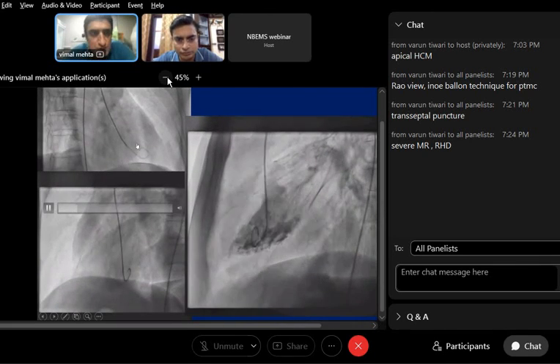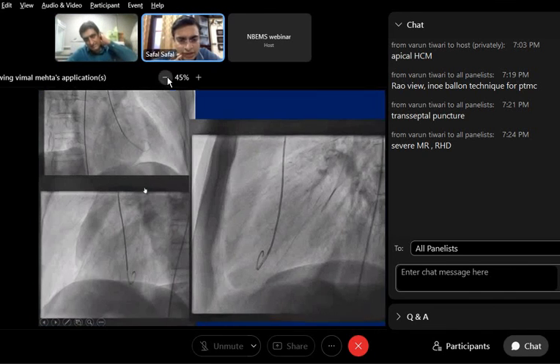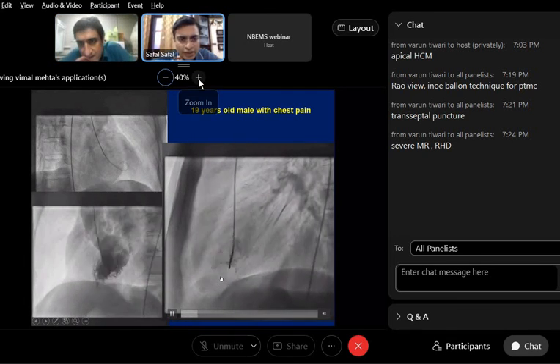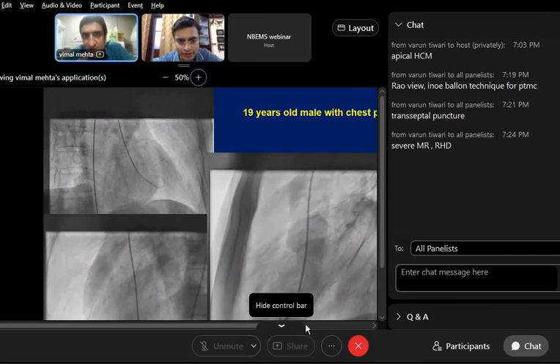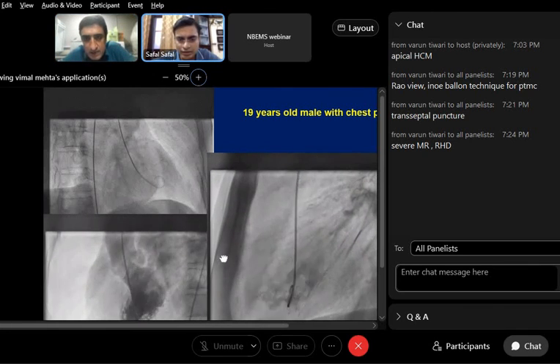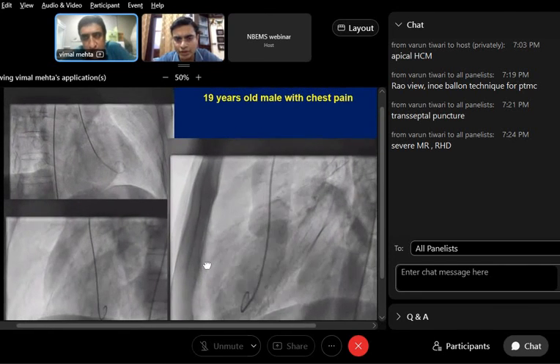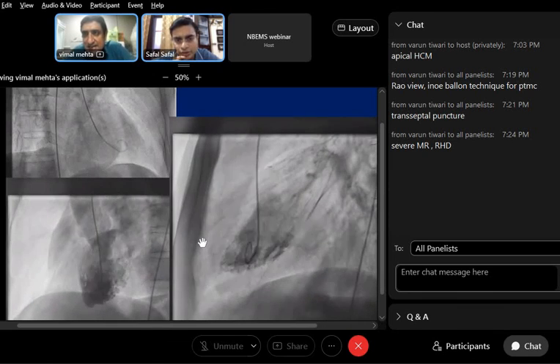So this was a case. Think about it. We are in the LV. Something is filling, which is actually posterior to the LV. Look at the third image. Comment on the LV. It is a relatively healthy LV, and a young fellow. And to tell you, coronaries were normal, a little bit of plaque in one of them. Somebody is writing VSD. See the third view. The RV was... yes, somebody has said it already.